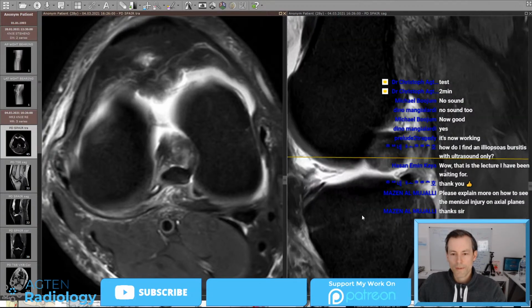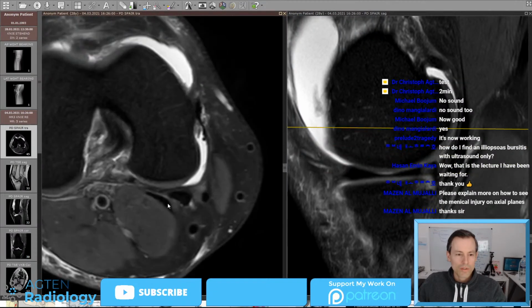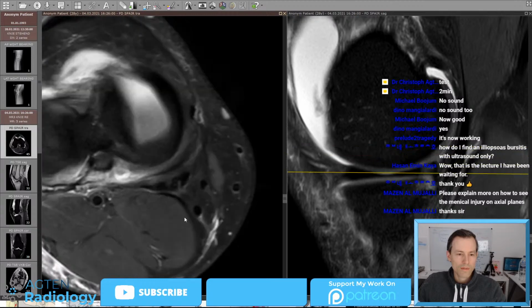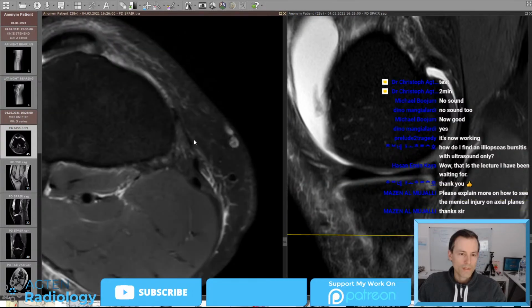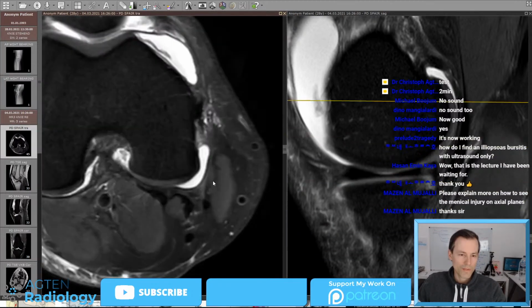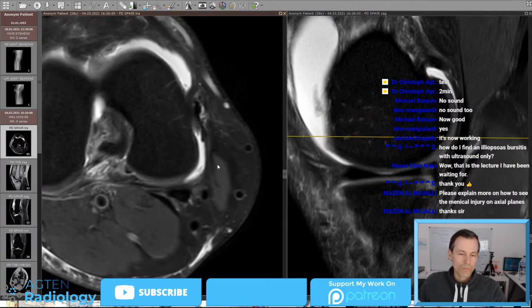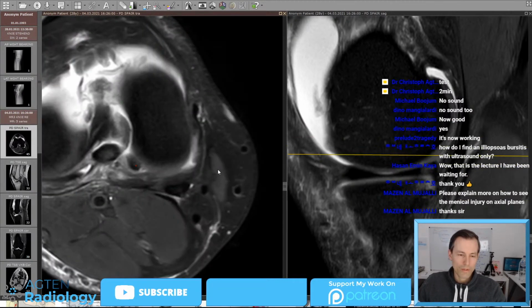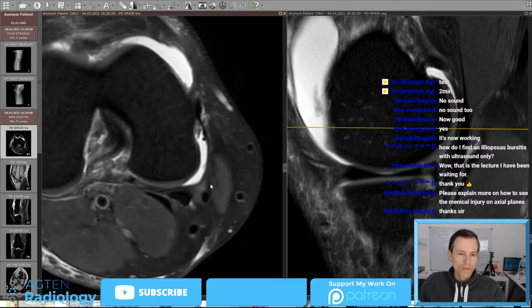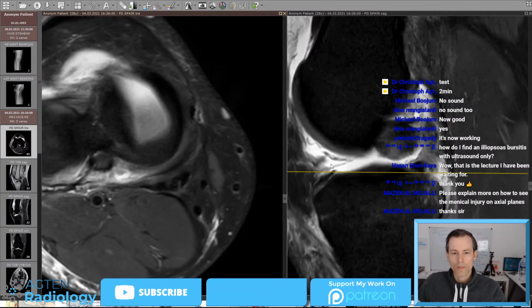Now moving back to the medial side. So once I covered all the other structures, so Baker's cyst, not really important, nevertheless still writing it down. Then you also want to make sure you have the pes anserinus tendons or fascia, muscles, etc. everything all right here. Sometimes you can see if they used one of these tendons for grafting for ACL repair. You can see some scar tissue here, so this is a good indication to realize where they took the graft from. So always look there too. And the one thing I forgot about now is the cartilage, which should be early in the report, obviously.